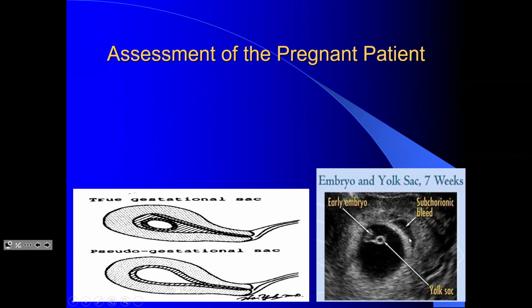Another thing that is seen here is fluid surrounding the gestational sac. Sometimes you would see hemorrhage around the gestational sac. Earlier on, there are chances of pregnancy presenting with PV bleeding, and sometimes the sac is not fully implanted, and you would have some hemorrhage around it. This is known as subchorionic hemorrhage, or perigestational sac hemorrhage, that you see sometimes in early pregnancy. Such cases are called threatened abortion. So chances of abortion increase when this hemorrhage around the gestational sac is more. We'll see examples of this later on.